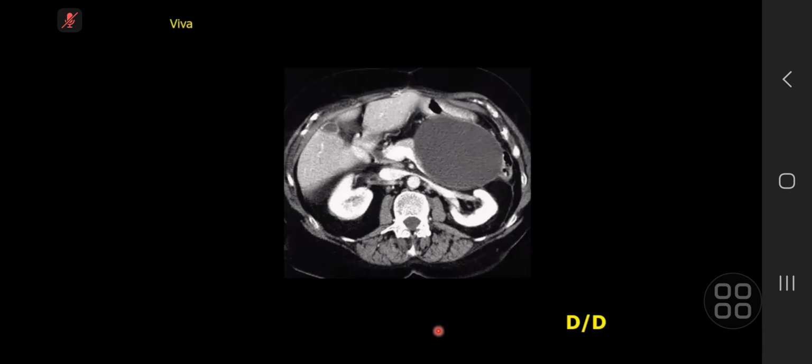So I'm presented with CT scan axial slices at the level of pancreas and kidneys, which shows a large, well-defined cystic attenuation lesion within the body and tail region of pancreas. It is thin-walled, and there is very, very mild enhancement, maybe anteriorly.